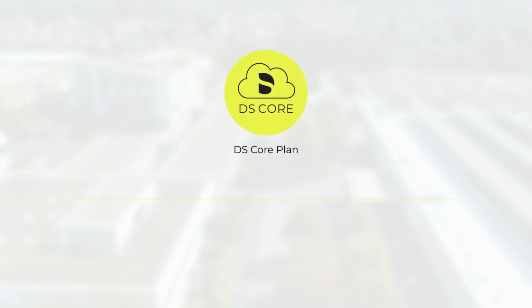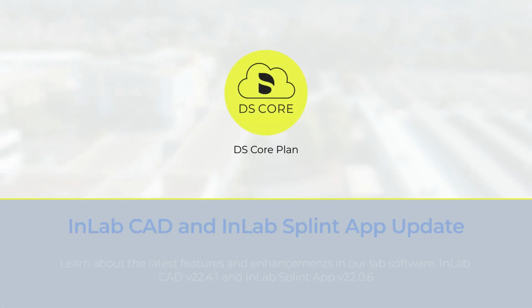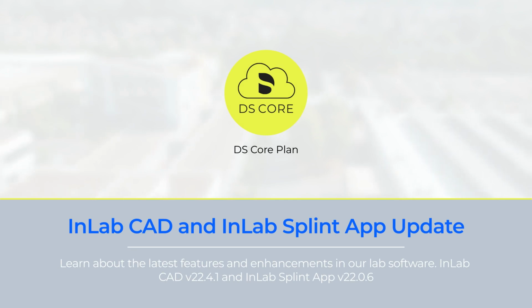Welcome to DS Core Plan. In this tutorial, you will learn about the latest updates and features to the design software InLab CAD and InLab Splint App.